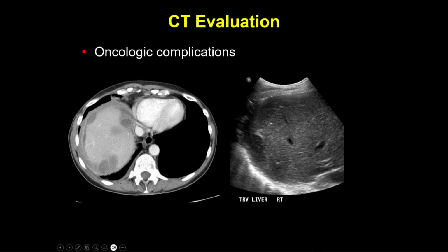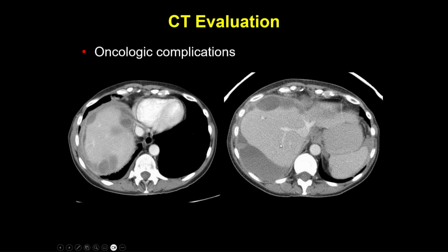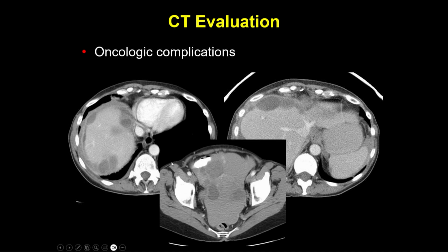And then complications we can detect. This is a patient with a sarcoma. So this is sarcomatosis, and this patient had an angiosarcoma, so actually had a risk for bleeding. This case not only progressed, but there was hemorrhage within this metastatic disease. It was a horrible case because it's very hard to treat, obviously, but this is hemoperitoneum in the setting of primary peritoneal angiosarcoma.